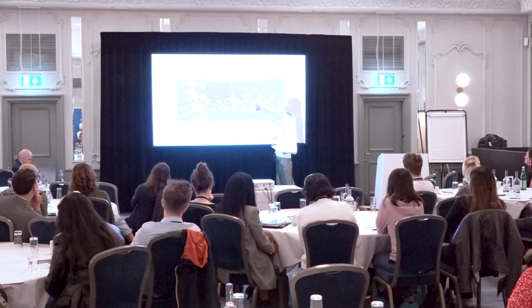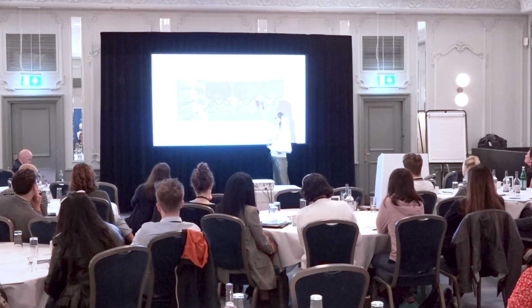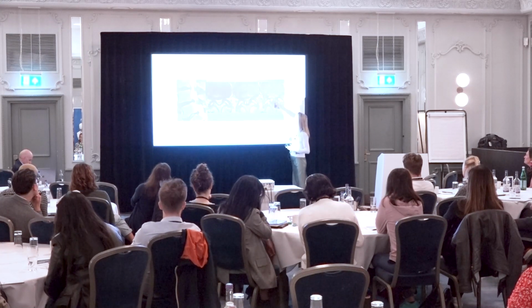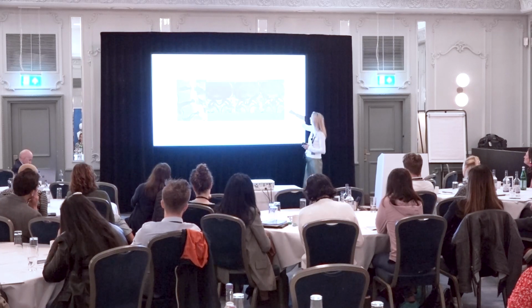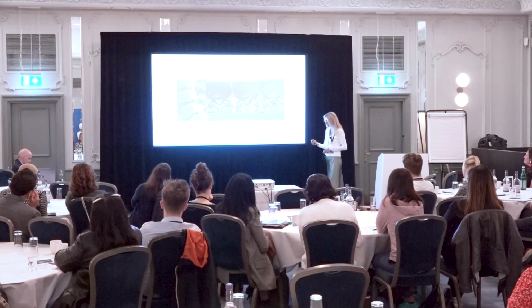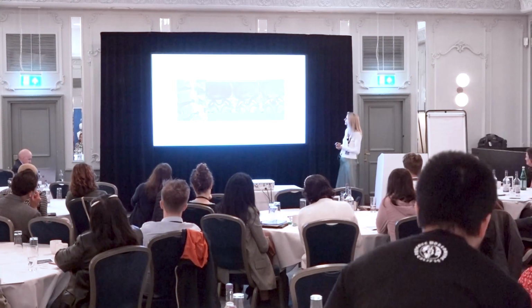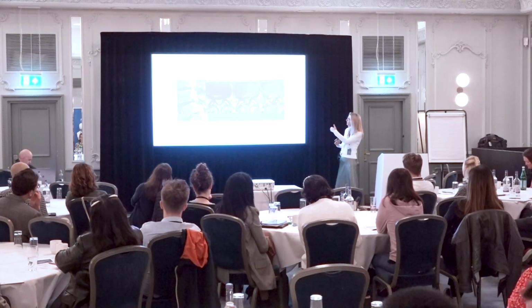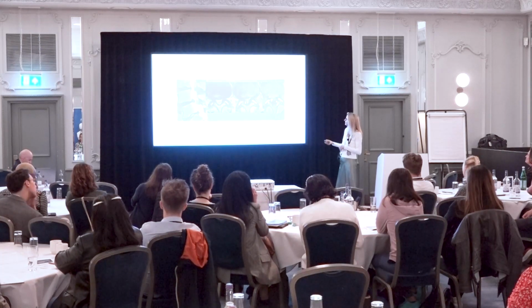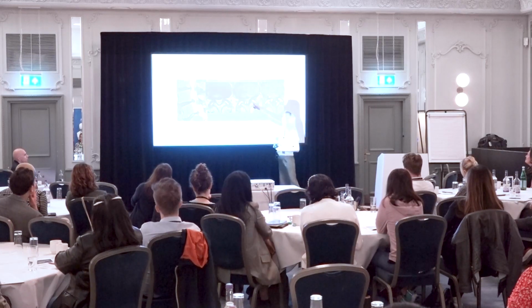This is just showing a more marked version of the above. You've got bigger ligaments, you've got slightly more degenerate facet joints, and you're beginning to get synovial cysts. And then here you've got a whopping great synovial cyst, in fact on both sides, synovial overgrowth, and you've got a very narrow canal. So it's just the various things that can contribute to spinal stenosis, and then from the front you have disc coming backwards. So in all of these cases you're going to get nerve root compression. And you can see here you've lost CSF signal.